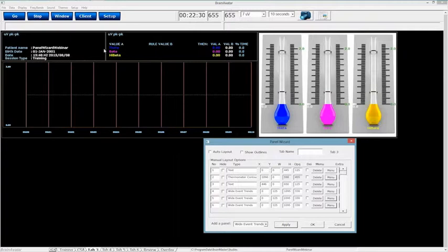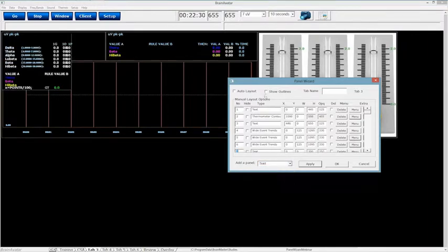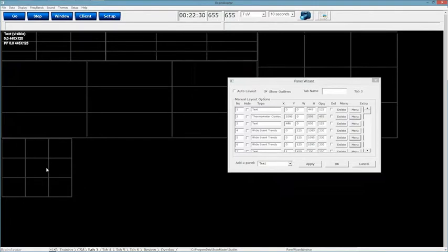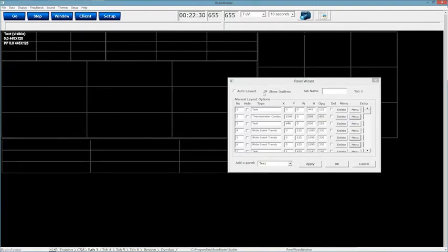So now basically what I've done is I've customized this to the event information. I have more room, so if I really wanted to, I can go and add more information. Like I can go right here and I can go to my texts. Bring this down.